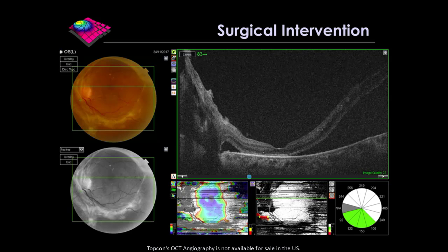We get the Triton scans and look at her fovea now. Remember how her fovea in that left eye looked just a few months ago. And now it's almost as if her fovea is about to come off any second. And her vision is 6/9. Okay, maybe you might be able to make that out clinically if you're paying attention and you're quite good, but actually it's really quite easy to look into these eyes and not necessarily see the extent of the tractional changes.